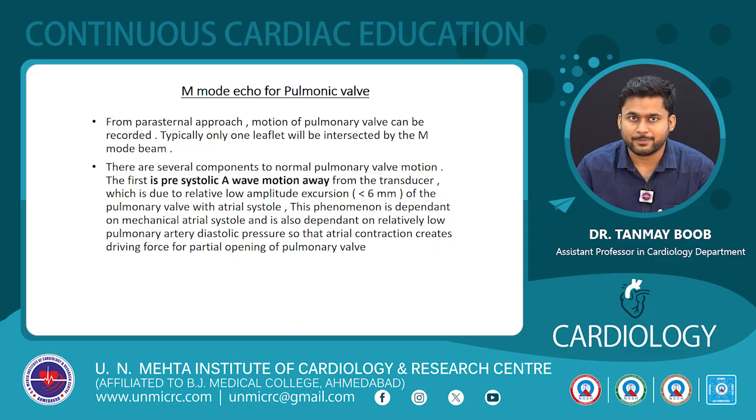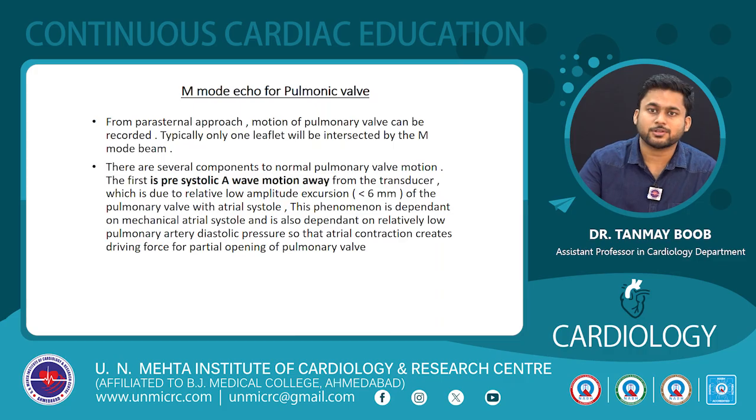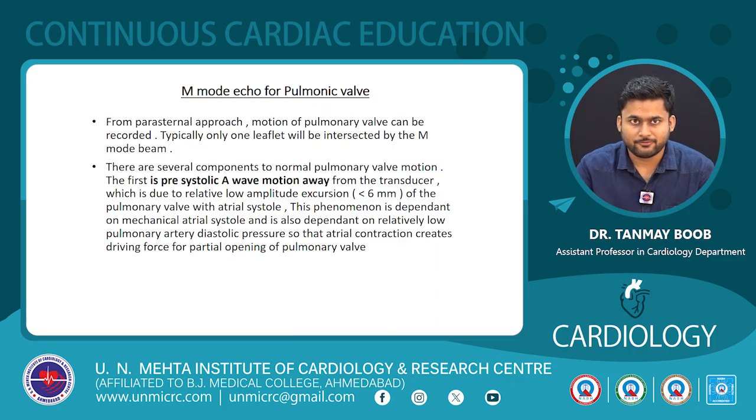This phenomenon depends on the following things. Firstly, the mechanical atrial systole, and it also depends on the relatively low pulmonary artery diastolic pressure, so that the atrial contraction can create a driving force for the opening of the pulmonary valve, which we will see in the following images.